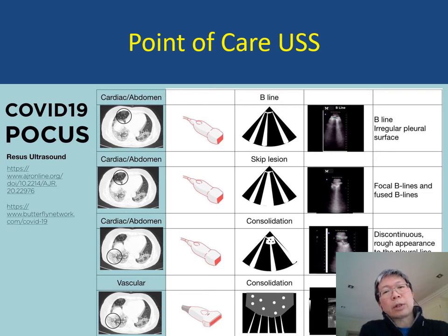Patients with normal chest X-rays and the absence of any characteristic features on ultrasound may be discharged for early follow-up. Some of the classic features on lung ultrasound have been described here, and they closely correlate with CT findings of the chest. Availability of this imaging is currently limited by local expertise.